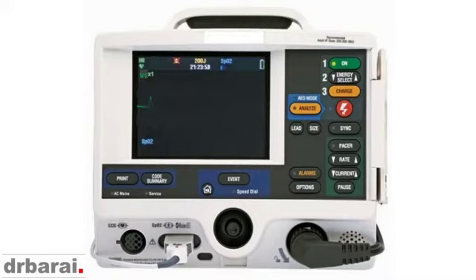If you find epsilon waves in the defibrillator machine, ECG monitor, or a 12-lead ECG, especially in V1, V2, V3, this is a classic presentation of arrhythmogenic right ventricular dysplasia. These patients can have sudden cardiac death unless appropriate measures are taken, for example, an AICD device insertion.